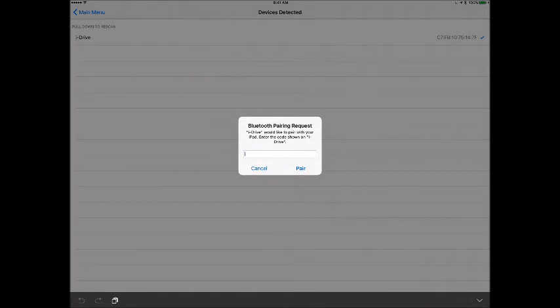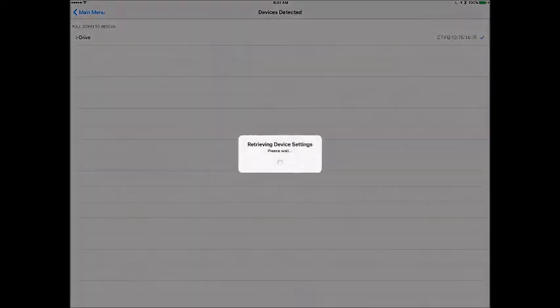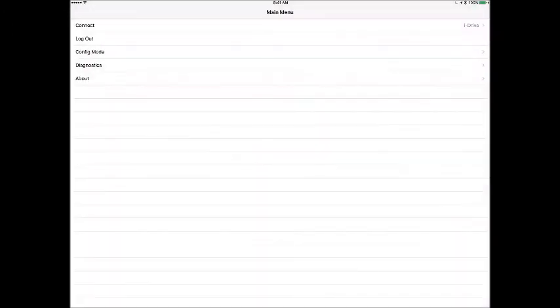It is on the interface, and we always provide a serial number there. So I'm going to go ahead and type in the serial number, but of course we've got thousands of these, and we're going to go ahead and pair it. Now it's communicating with it. I do need power to the device, which, again, you could do with a power wheelchair, or with our battery pack adapter.